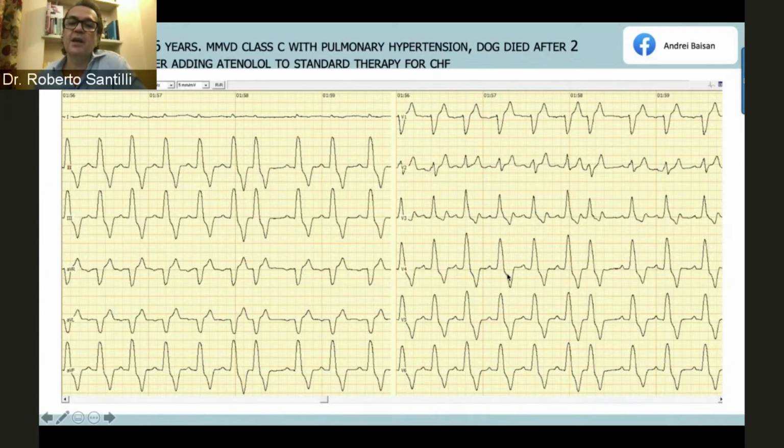So when you have bundle branch block due to either inflammation or degeneration, you can have different amounts of block. When it's more, you have a wider and taller QRS complex, and when it's less, you have less block, it's a little bit narrower. It's important when you have no change in the rate. When you do have change in the rate, just like this one, actually this can be an aberrancy. You can have functional block that goes on top of an anatomical block.